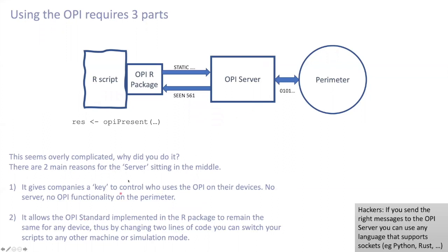It also allows a standard set of functions to be implemented here, and the translation to different machines happens here. A little note here, if you're a hacker, you can send the right messages to this server using any programming language at all. You don't have to use R. It's just easier if you use R.